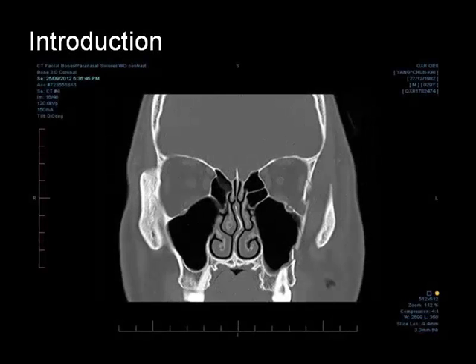Facial bone anatomy is presented in this media module. Like the cranium, sectional imaging of facial bones can be performed to evaluate for the extent of trauma, examine for masses, or aid in the diagnosis of specific bone diseases. CT is the best modality to determine the extent of facial bone trauma since the bone window provides such fine detail. To examine for the extent of tumor invasion, MRI is often used for its better soft tissue demonstration.